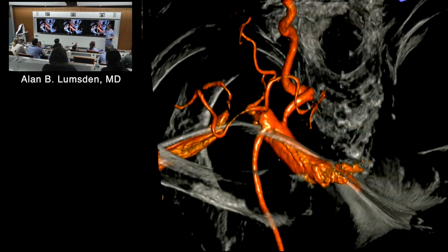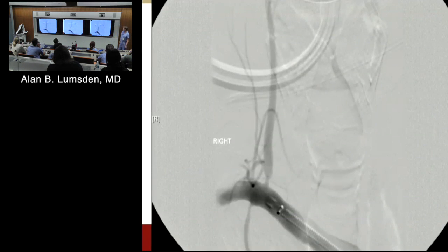Okay, what's this? Do you know what we're looking at? This is the jaw, all kind of pulled out of there. These are the ribs. Vertebral. Okay? Internal mammary artery. You just segment out the areas that we're going to be interested in. All right, now, let me see if that actually flows.